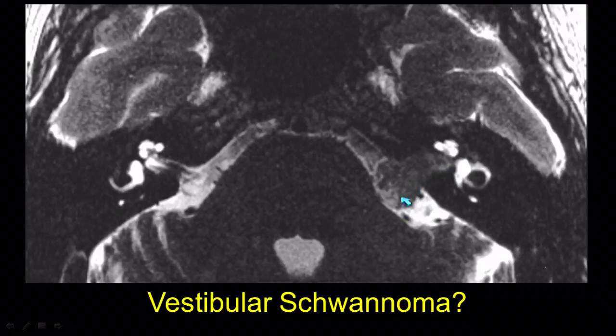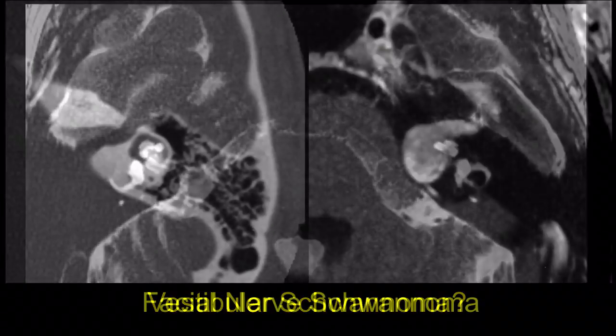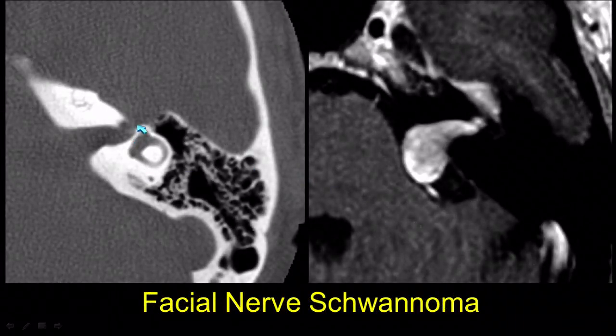And this patient had a pretty nice ice cream cone looking lesion. It's in the IAC and extending out to the CP angle cistern. They thought it was a vestibular schwannoma, so they went and cut this out. And postoperatively, the guy's face wasn't moving. What they didn't notice preoperatively was that the labyrinthine segment was very widened, with enlargement of the geniculate ganglion, and we have avid enhancement along that course.